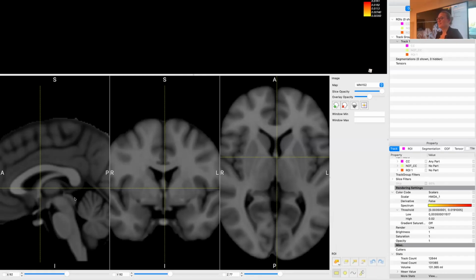Inferior frontal gyrus. Yeah. And what will correspond to Wernicke's area, is it the superior temporal sulcus or No one really knows. There's a huge debate. But for the argument of today's session, we're going to go with the posterior temporal cortex. So we're going to go STG, MTG, which includes the STS.